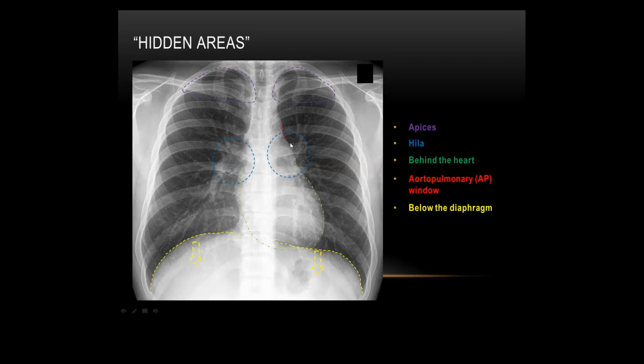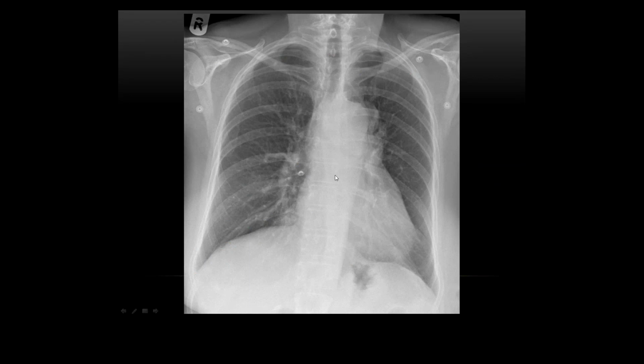So what's happening, if you look on this chest X-ray here, can you see how this is nice and concave? But actually it'll be bulging out around here because you've got that sort of suprahilar growth. So I said that's one that's not really documented in the textbooks, but it is a good area to look at. So what do you all think of this chest X-ray?